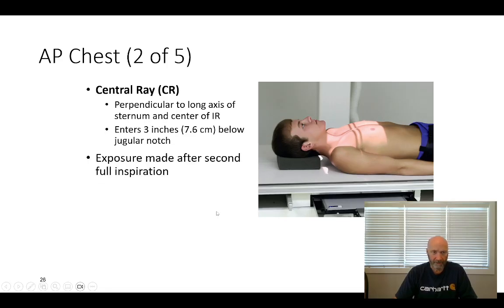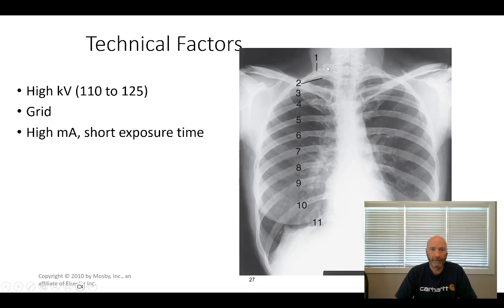It's really more of the same stuff. And what you should get, regardless of if it's AP or PA, you should get 10 posterior ribs in an ideal situation. You're going to have situations where you're not going to get 10 ribs.